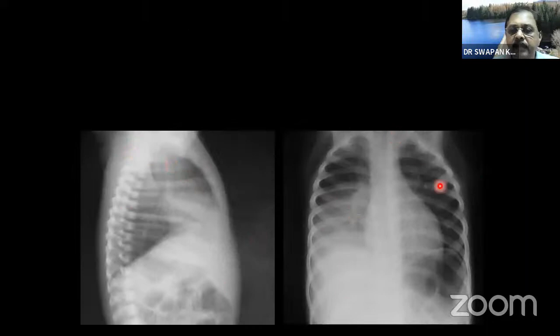So this is the magnified view. This is the cardiac silhouette, and you can see the vertebral bodies. It will not be so well seen, just like in the AP view. So these are the bronchovascular markings, and I'm showing you this is the lateral view, and you can see the more caudal one will look darker or radiolucent, and this is the opaquer. So it means this frontal and lateral view is okay.